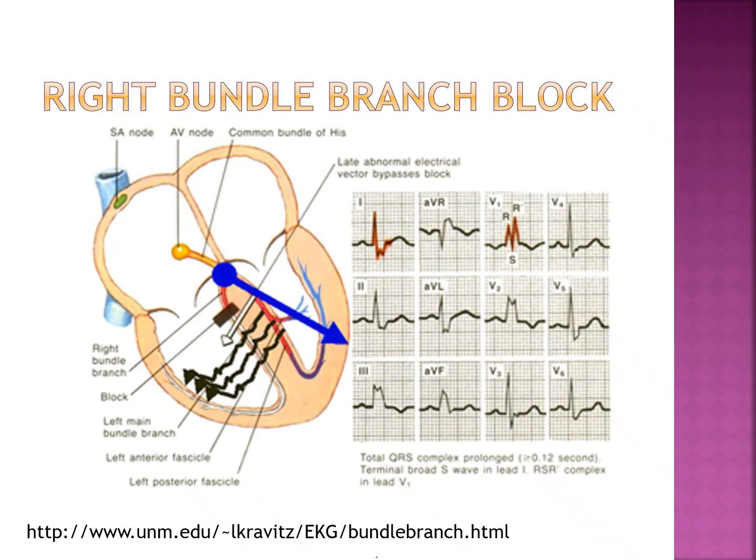And then in lead 1, you look and see whether or not the QRS complex is wide or skinny. Now I know what you're saying, but that's kind of a wide QRS complex. Not the first portion of it. It's kind of skinny, and you'll see the difference in just a couple of minutes when I show it to you. But we look at lead 1 and V6. They should look very similar to one another when we're looking at the bundle branch blocks. So notice how much thinner the QRS complex is, and that in the right bundle branch block, the terminal forces in V1 are going upward.